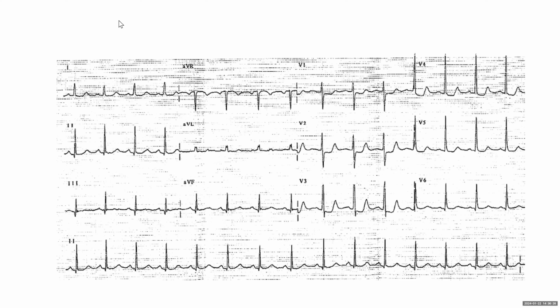I'm just going to start from the beginning. So Islam said old inferior. I think that's fair. In real life, though, are these pathologic Q waves? No, because they're not wide, right? Not so much, exactly. Yeah.